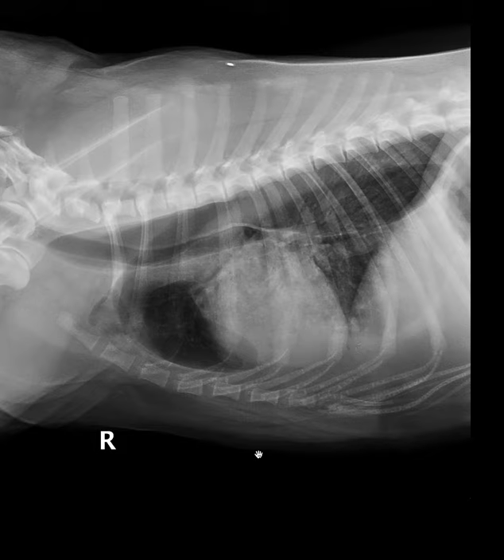So I want to start by pointing out what many of you have already noticed. We're all very familiar with the esophageal stripe sign, and often it jumps off the radiograph at us. What I want to take the time to tease out is what is the actual anatomic feature that creates this sign, because understanding that can help us understand when it could be normal and when it's an abnormal finding.